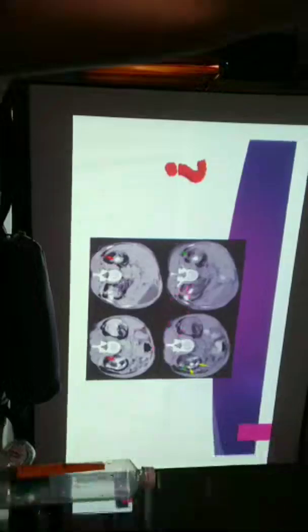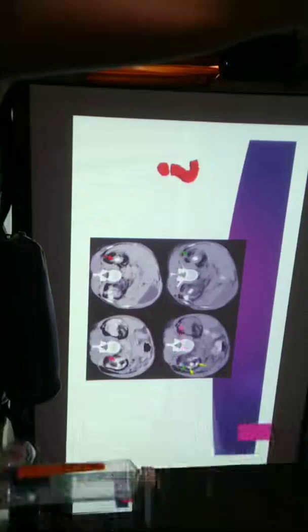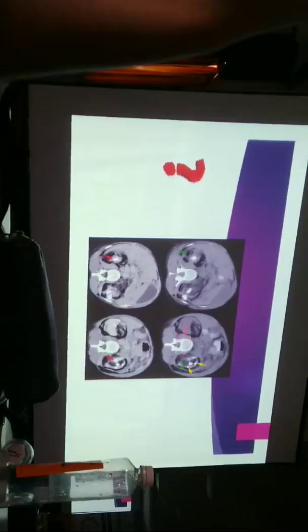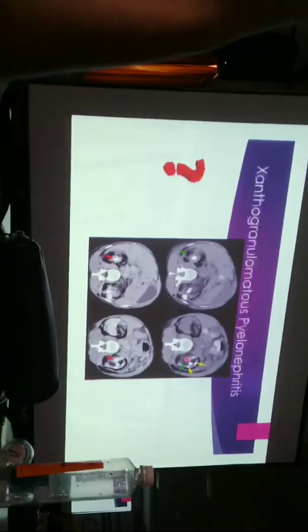What is this? This can be focal, mistaken for a renal tumor. So you can see the enlarged kidneys with fat within the renal pelvis with multiple calcifications. And if you do a CT urogram, you will see the typical bear's paw appearance after contrast.